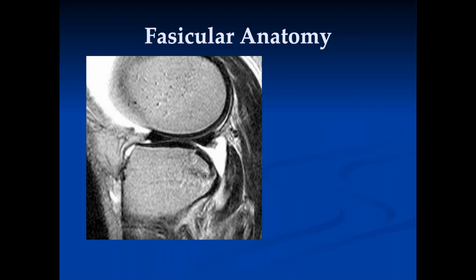But this is an interesting fracture, and I really don't know how it occurred. He had an ACL tear. Yeah, we have an ACL tear, but how did that fracture happen? That's a kind of interesting set of forces involved.